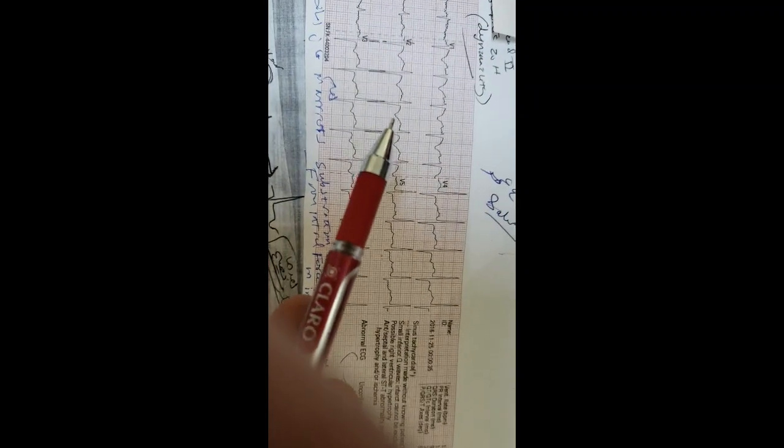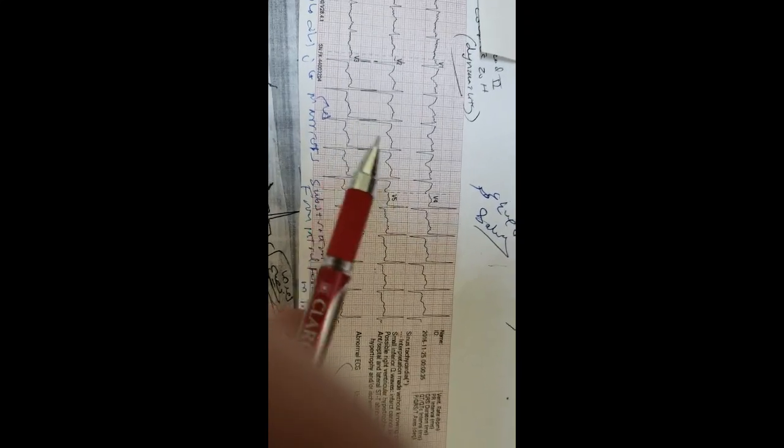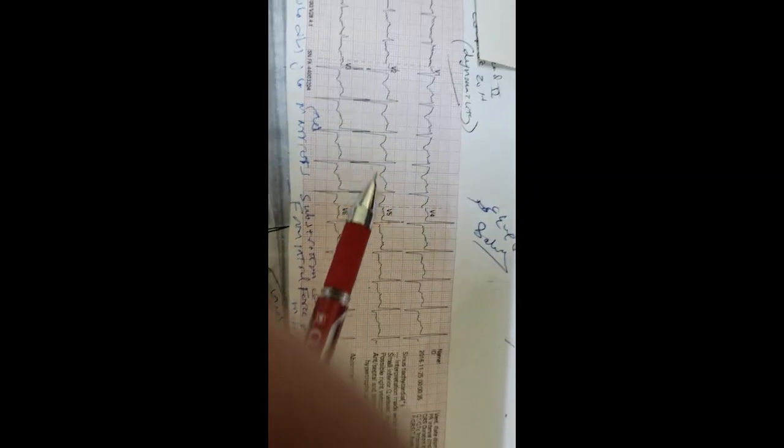As you know, we understand that this ECG change is indirectly caused by a dilated right ventricle, particularly the right ventricular outflow, but surprisingly the similarities are restricted to pulmonary embolism, or more specific in pulmonary embolism: inferior and anterior ECG changes, and the second female patient also had a pulmonary embolism.